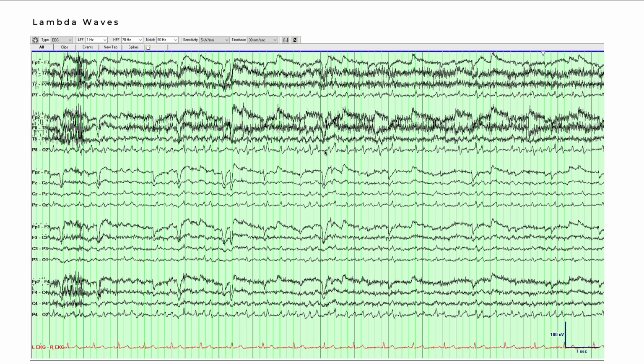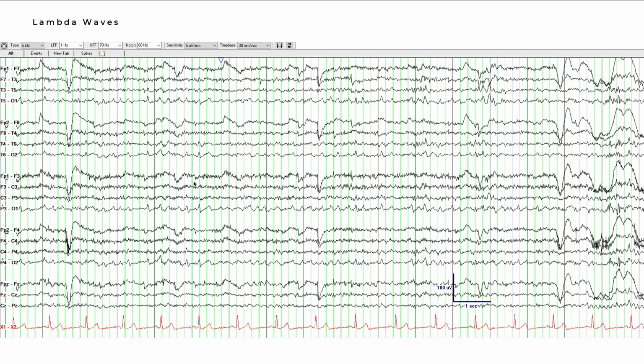Here's an example where you see these waveforms. The patient's awake, vertical eye blink artifact, and you're having a little bit of horizontal eye movements in here, and there's basically visual scanning of some type going on, and you see these lambda-shaped waveforms in the occipital region. Here's another example of this. You're seeing these lambda waveforms during wakefulness. This is a normal finding and nothing to worry about if you see this. Especially in younger adults, you'll see this very prominently, frequently.